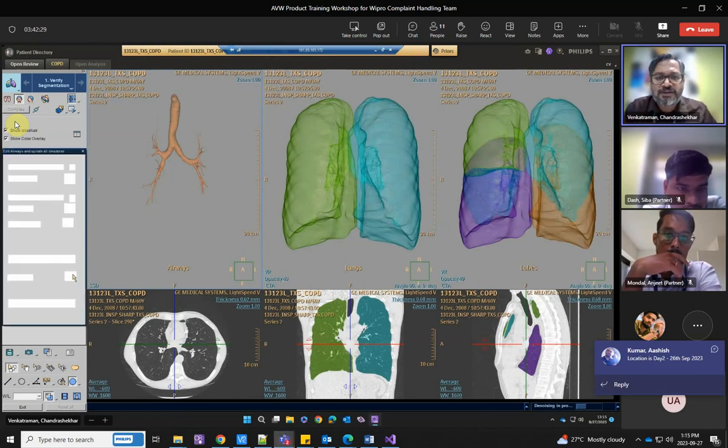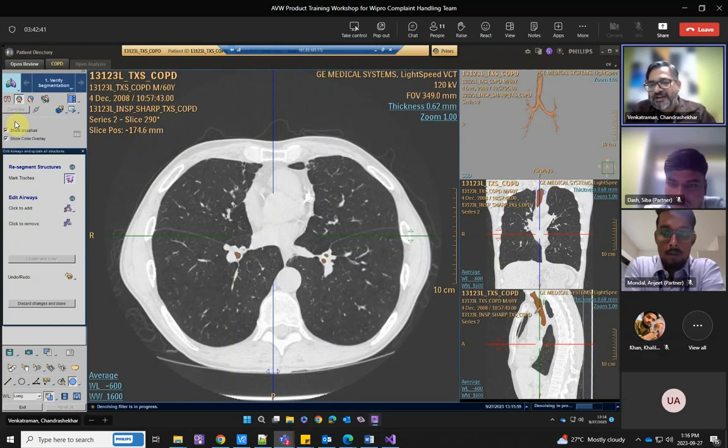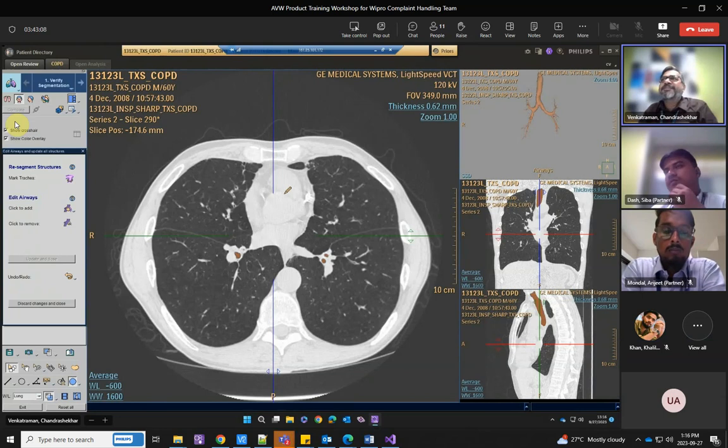If you want, where the airway tract starts, that's called the trachea. The first editing tool is where we can correct things if the anatomy is not identified correctly. Sometimes I've seen that in the COPD application, if by chance the scan used is actually below, that is the lungs are not full and it's more of a thoracic scan, then a little bit of the lower parts of the body gets identified as airways.